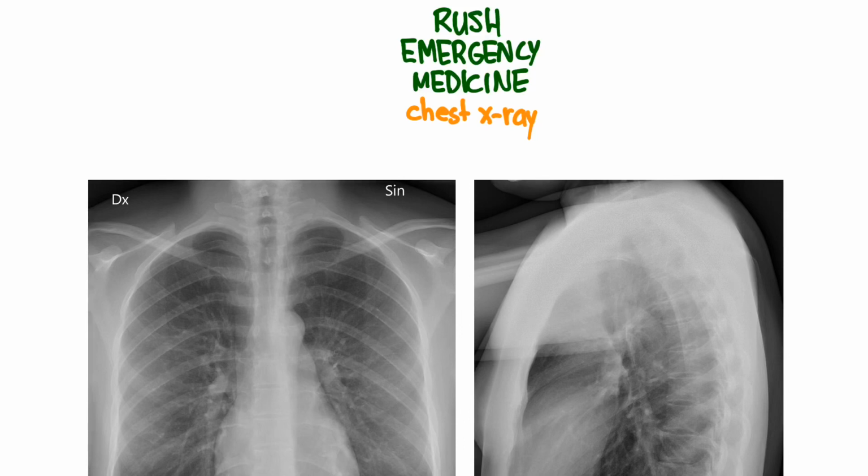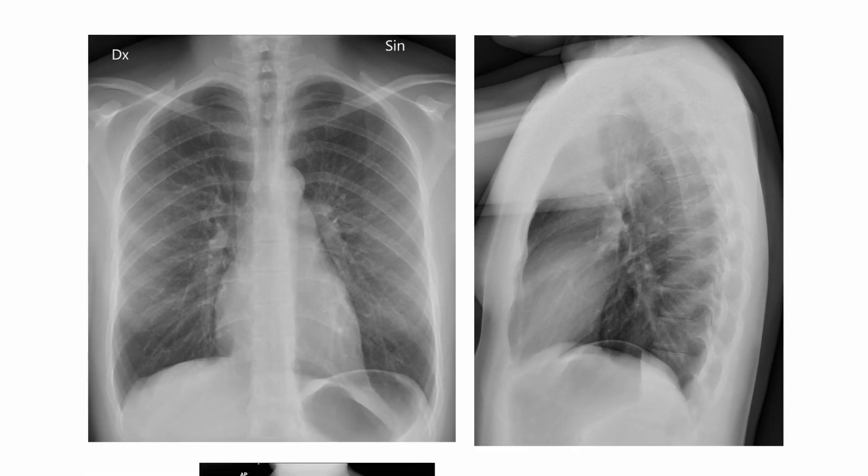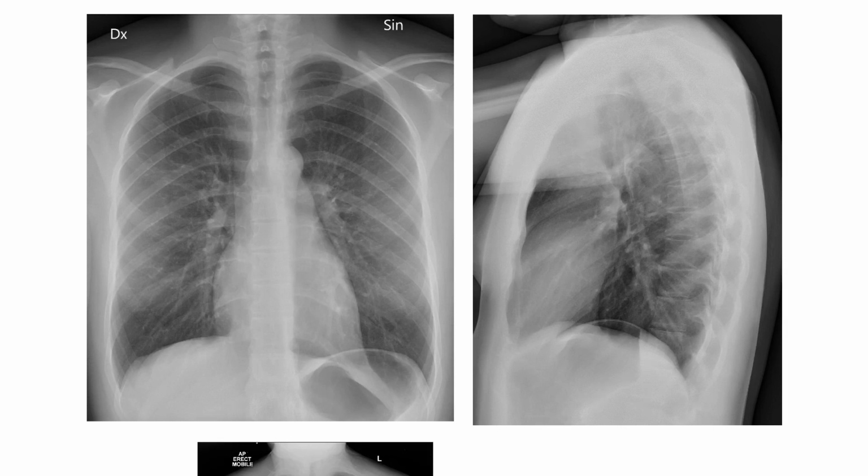Hi, welcome. So in this video we're going to talk about reading a chest x-ray. In particular, this first one we're going to talk about the anatomy of a chest x-ray. So you see here two views of a chest x-ray.